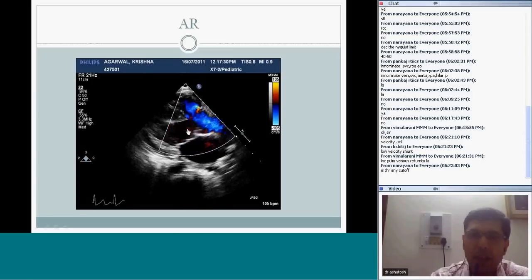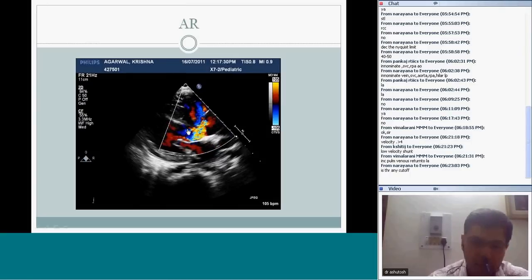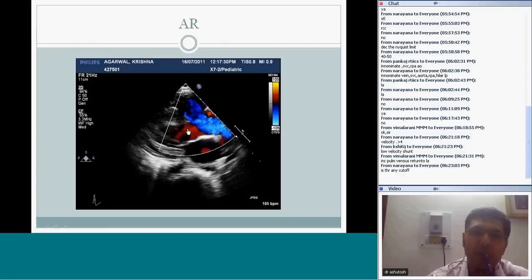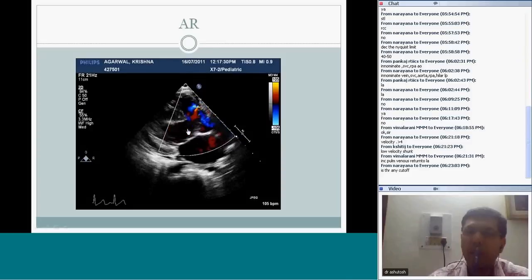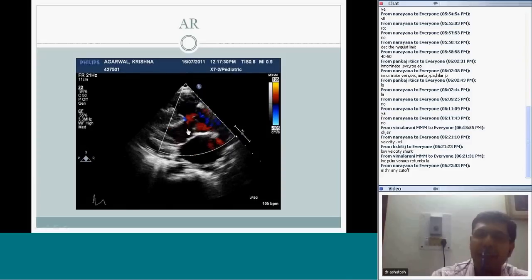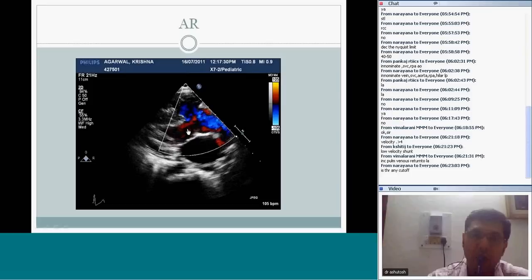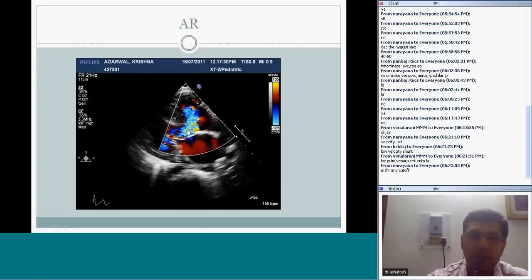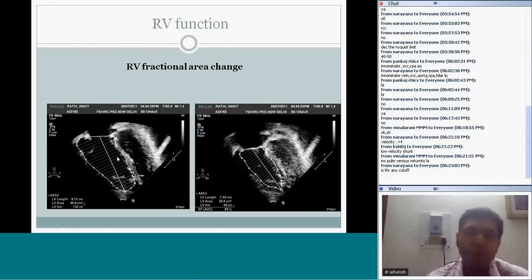Aortic incompetence usually tends to be progressive. It can be there right in the beginning, like one of these patients who had significant aortic incompetence, so a valve had to be repaired at the time of surgery itself. But even in the post-op period, some patients can have progressive AR and require aortic valve replacement. Aortic incompetence is linked besides pulmonary incompetence, which has to be looked at every time the patient comes for follow-up.